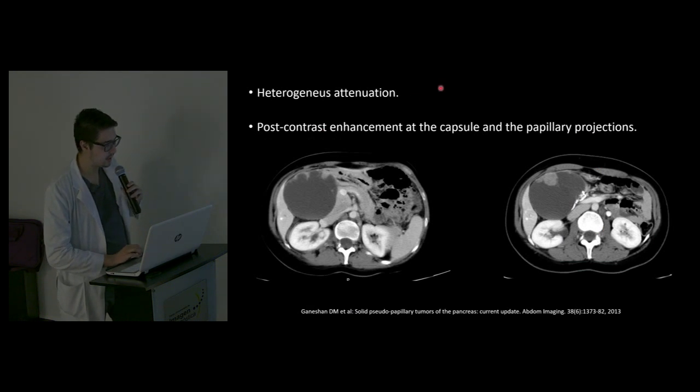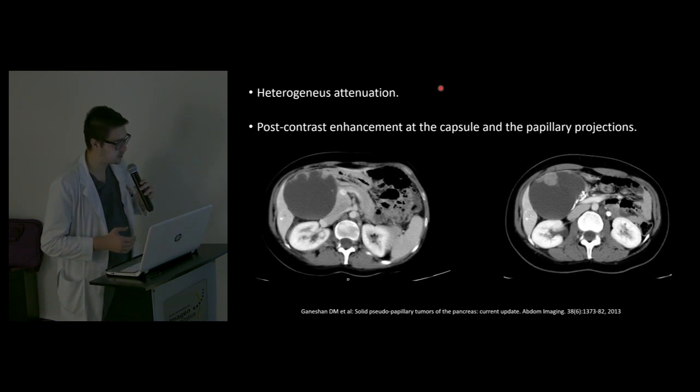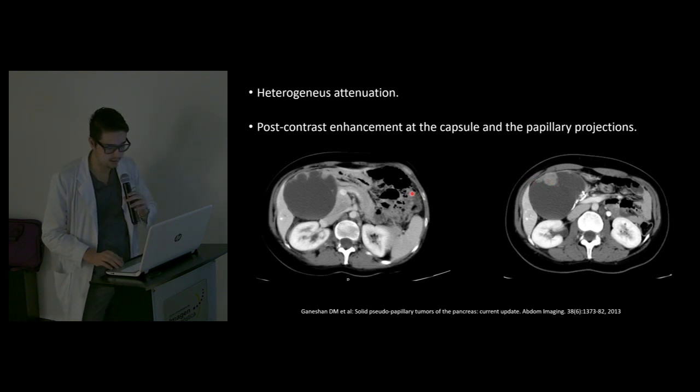At CT, the solid part has a heterogeneous attenuation, and it also has post-contrast enhancement at the capsule and the papillary projections, which is also very distinctive of this tumor.